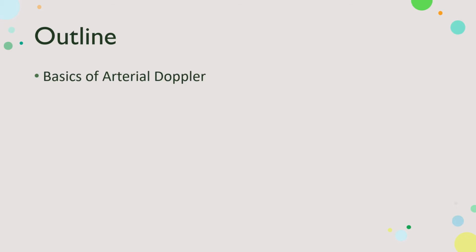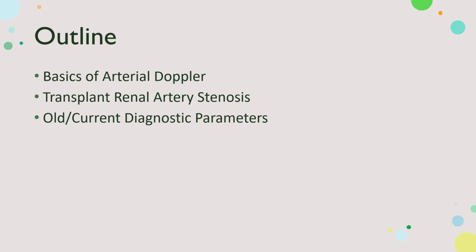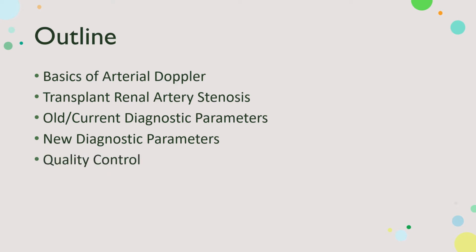So we're going to go over basics of arterial Doppler, transplant renal artery stenosis in particular, our old/current diagnostic parameters, our new diagnostic parameters, quality control, and then we'll touch on contrast enhanced ultrasound.